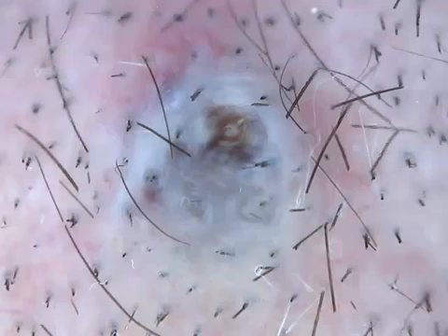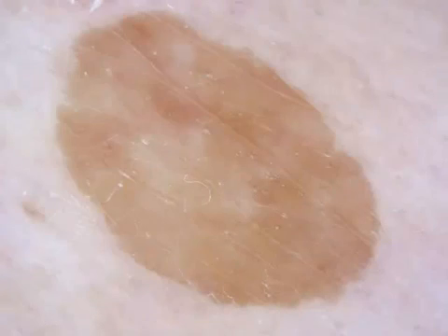Here, dermatoscopically, is a lesion that is also structureless and blue. In this case, it's not a blue nevus, although it could be one. It's an important differential diagnosis. In this case, it's a melanoma metastasis, which is a differential diagnosis of structureless blue lesions. Structureless brown, as I already said, can be a flat seborrheic keratosis or a solar lentigo, as in this case.